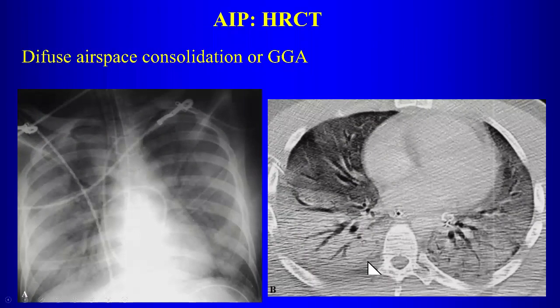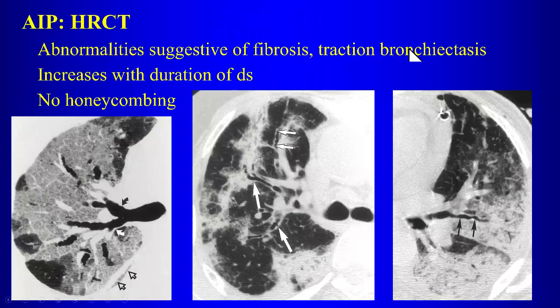What is the hallmark of ARDS on the CT? What am I illustrating here? Ground glass. Well, this is more than ground glass. You have air bronchograms, right? This is airspace disease, consolidations. But what is the... Yeah, this gravitational gradient of opacity, right? It's denser in the dependent portions of the lung, because with ARDS, the lungs get very heavy and stiff. And a lot of what we're looking at is actually atelectasis. So that gravitational gradient of opacity towards the dependent portions of the lungs is a hallmark of ARDS on imaging. So it helps to recognize that, okay?